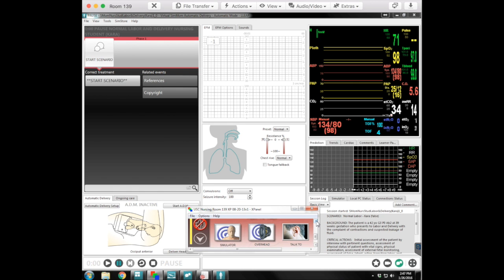That's where we have a body pack that we can give to maybe a family member that's in the room. You want them to get kind of crazy, but you don't want anybody to know that. If you click on this button, you can talk privately to that individual and direct them in the room to do something that you don't want anyone else to know about. So we're good. We got that up.